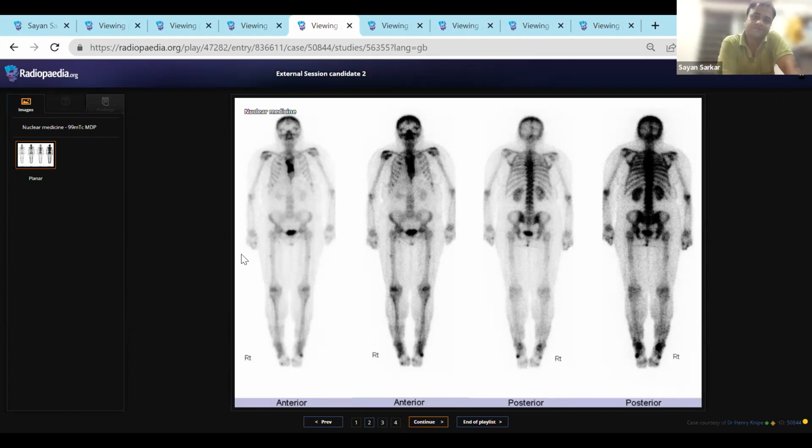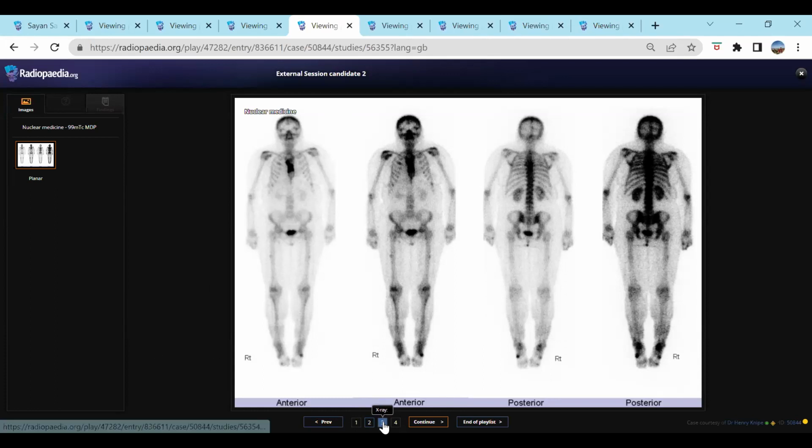Other than that, they're very bilateral and symmetrical. I'm not very sure what they could be. Any other image you want to do to see what they are? Yes, I would want to. In my normal practice, I'd look at the femoral radiographs. X-ray of the femur, yeah.